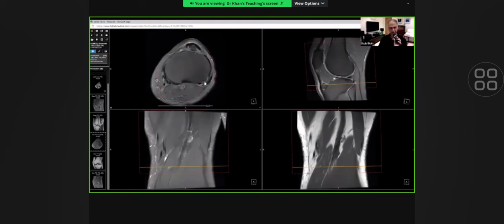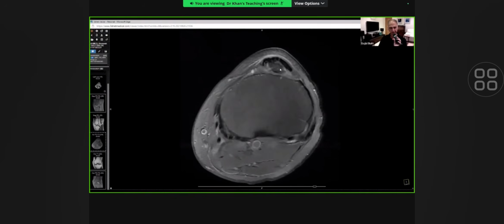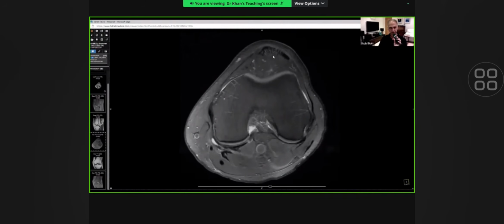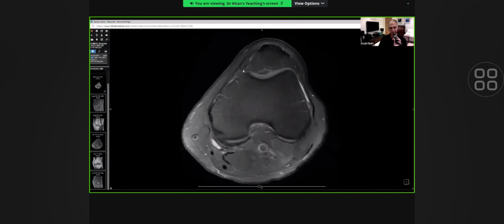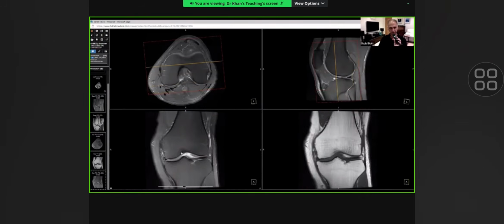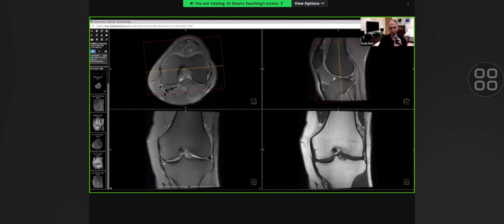Have a look at the axial imaging. We've got the bright signal intensity in the lower ligamentum patellae. In the axial imaging, we've got some bright signal intensity in the upper half. No chondromalacia patellae. So this patient has a complex shaped medial meniscal tear, some longitudinal component, some horizontal cleavage component, a well-formed bone fragment deep to the ligamentum patellae, and some ligamentum patellae tendinosis.